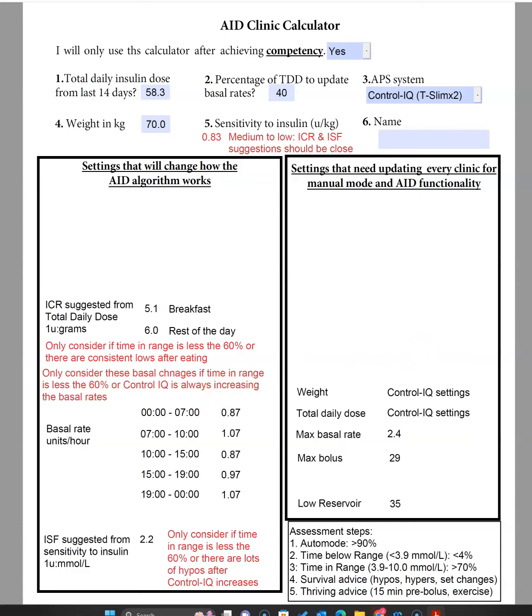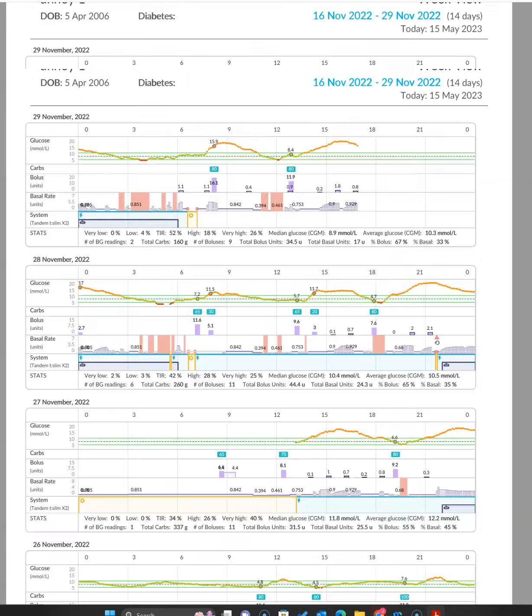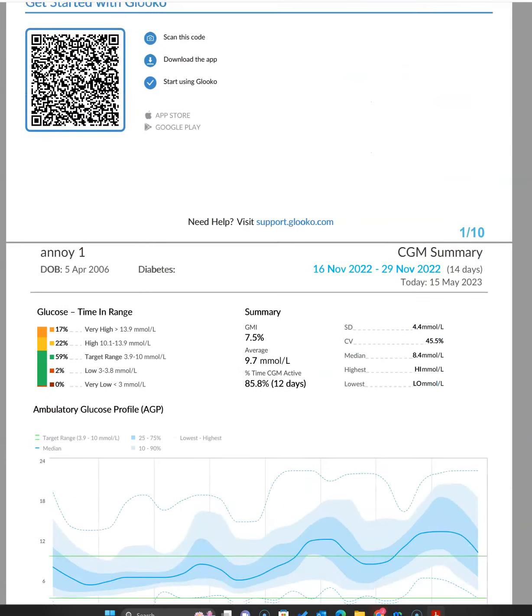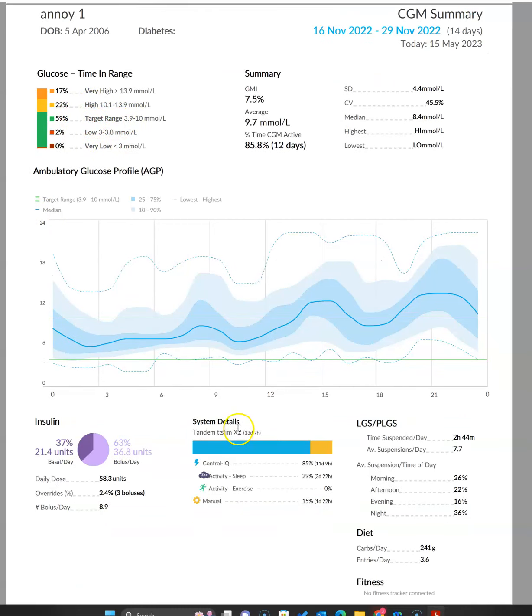So I guess the start of the consultation will be you've been through the download, you'll hopefully have done that with them, but if you haven't, you're going to walk through with them and explain that overall we don't have a problem with hypoglycemia. 60% time in range, you certainly need to squeeze that and make that more aggressive, and it's great that they're using Control IQ. Not full time, it needs to be above 90%, but they're certainly entering their insulin, and then there's a suggestion that the insulin at lunch and evening meal are inadequate.